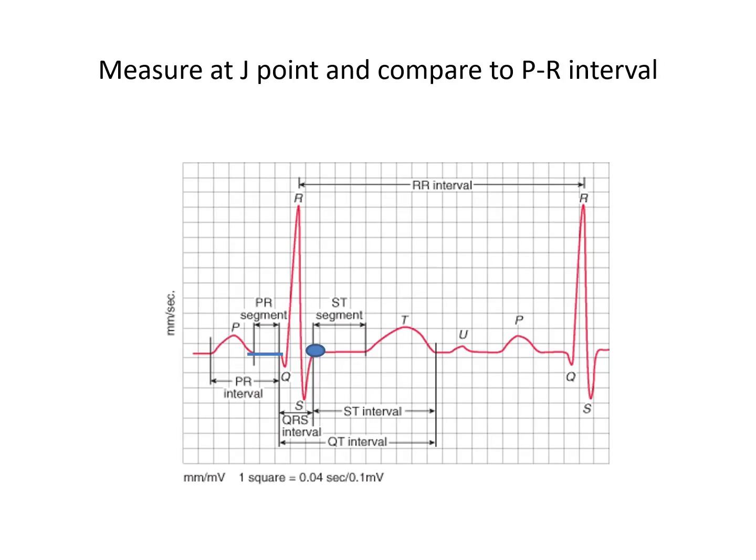So first we have to define what we're basing the ST segment changes on, and we're basing it on the J point. So the J point is the transition between the QRS or depolarization and the ST segment or the repolarization. And it's the inflection point at the end of the S wave. So that's the last negative deflection of the QRS and the beginning of the flat portion of the ST segment. So wherever we have the inflection point, that's the J point. And we compare that to the preceding PR segment.